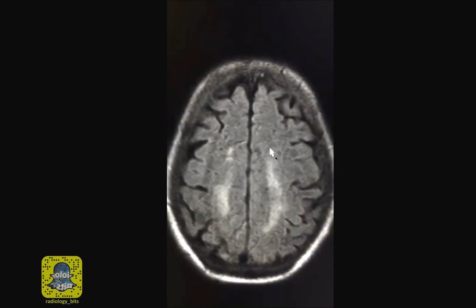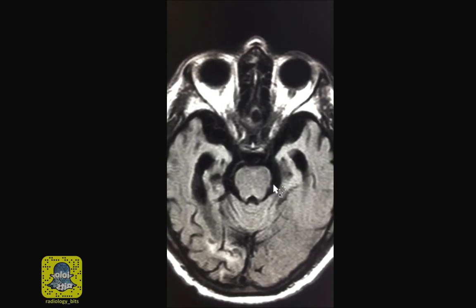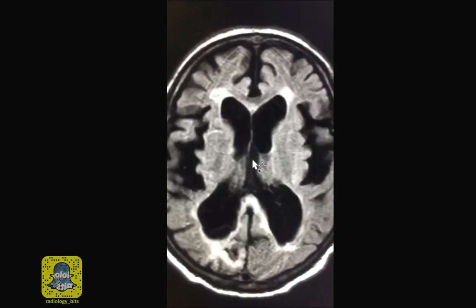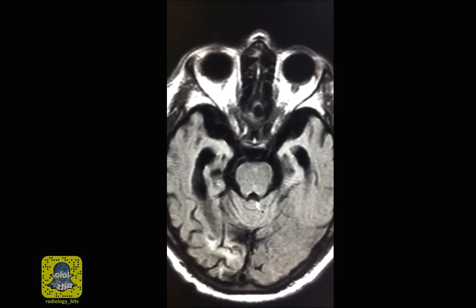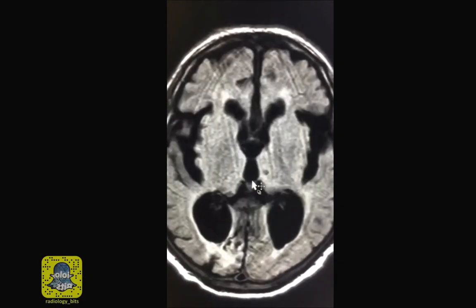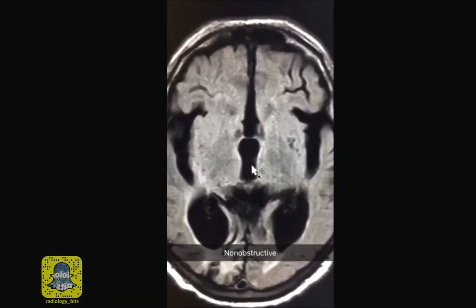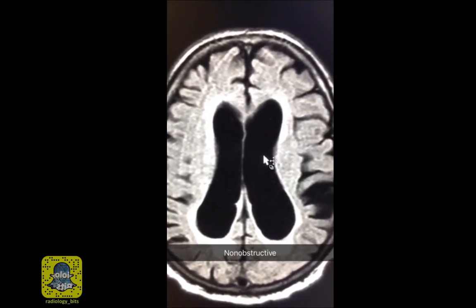The first thing to make sure of is that there is no obstructive lesion that leads to such dilatation of the ventricle. In this case, the lateral ventricles are dilated, the third ventricle is dilated, and although the fourth ventricle is relatively within normal size, there is no obstructive lesion. This thin linear dot is actually the cerebral aqueduct of Sylvius that connects the third with the fourth ventricle. So now we made sure that there is no obstructive lesion, and if what you're looking at here is true, this is a form of non-obstructive or what we call communicating hydrocephalus.